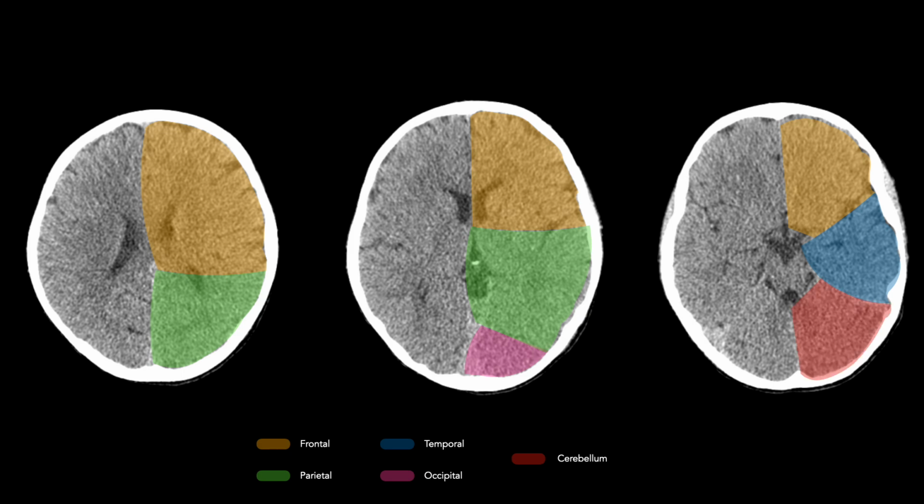Here is the cerebellum. And how do we know it's a cerebellum? Well, if you follow my cursor, I hope it's visible, there's a hyperdense, small white line moving here. And this is the midbrain, we're going to discuss it later. This is the tentorium cerebelli, and once you see it, it means we've started reaching the cerebellum. So this is the cerebellum.